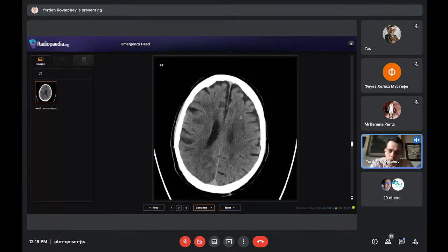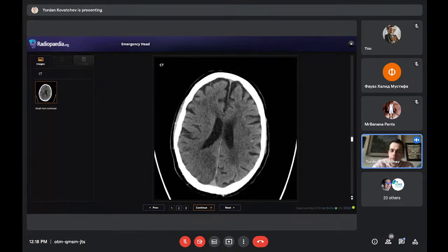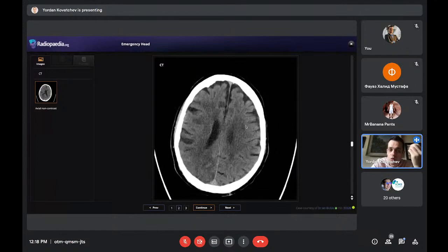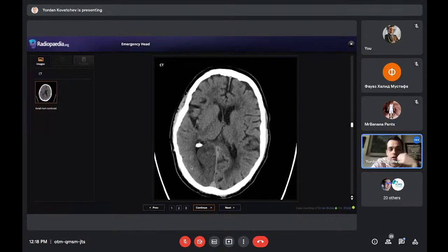The patient also has what we call microangiopathy, or small vessel disease. You see these hypodense areas in different parts of the brain. So obviously this patient has some vascular problem, maybe even some heart problem, that's giving emboli, and he's having small ischemic changes in the brain. But this one is big. This one, there is an infarction here in the right occipital lobe.